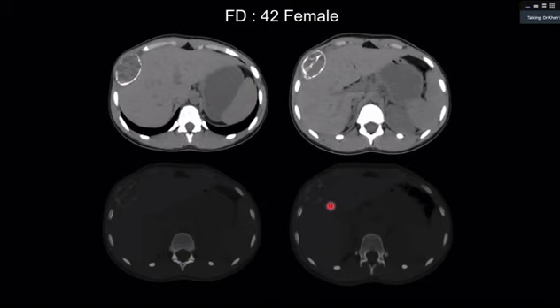Fibrous dysplasia is here. This is an example. If I report this CT, I will never be very confident in calling this fibrous dysplasia. But the point is, if you start thinking in detail, what can it be? So, 42-year-old, not a very old patient, very expansile lesion. Again, the cortex is not destroyed. Within it, there are now these lucencies, etc. This is not classical ground glass.